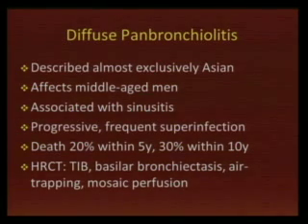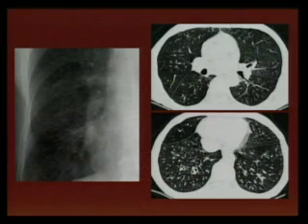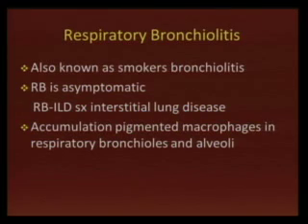And in the high-resolution CT, you will see the same findings as in any bronchiolitis. You can see the typical centrilobular nodules, the branching, bronchiectasis, and wall thickening. So you have to have the clinical history in order to make the final diagnosis.